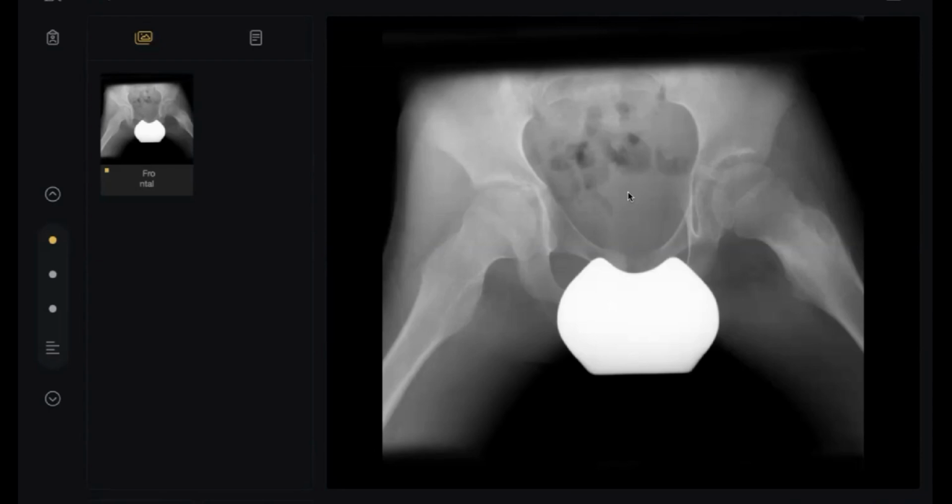Differential diagnosis: osteoid osteoma at the top of my list, because of the absence of history of fever, less likely to be osteomyelitis. I will tell you one experience of mine. In one viva, I asked the examiner one question. It was an abdominal X-ray, and really it was confusing.